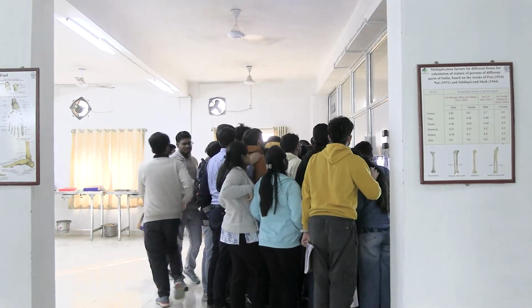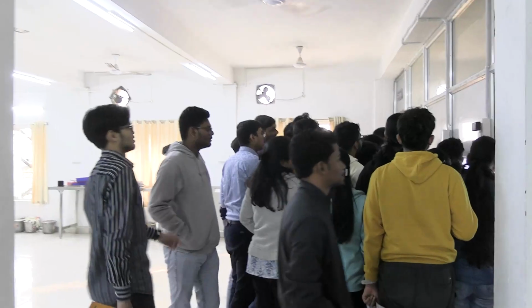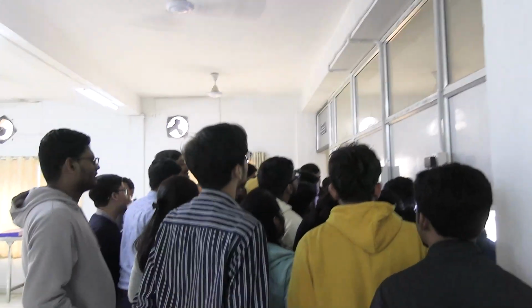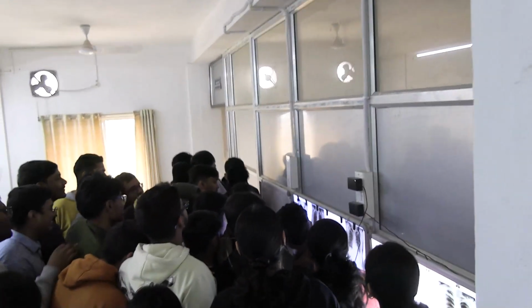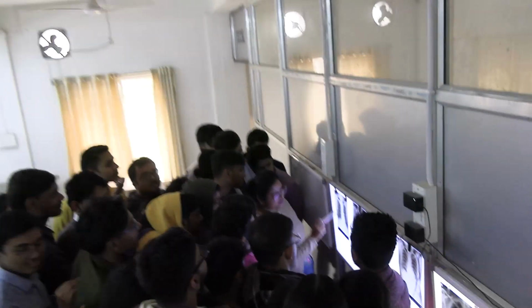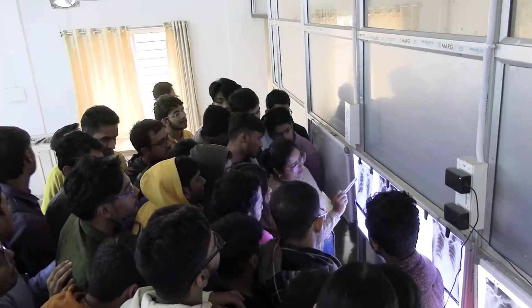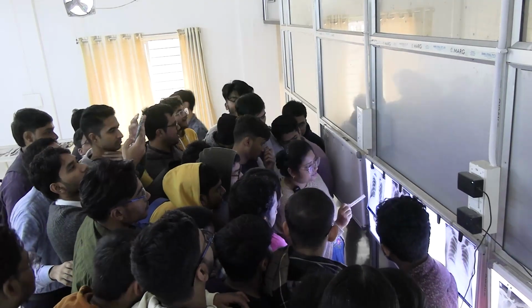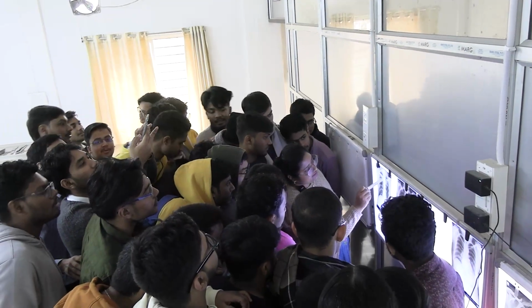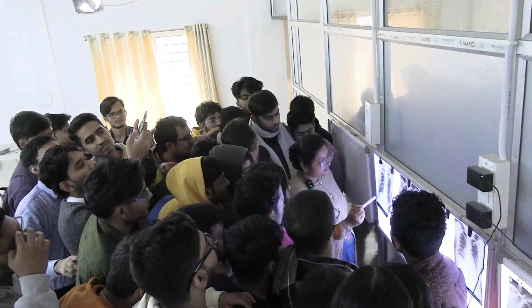This is the tracheal shadow, and these are the vertebral spines. Here is the clavicle, with sternal end and acromial end. This is the scapula. These are the posterior rib shadows and these are the anterior rib shadows. You have to identify them. These are the bronchovascular markings in the lung shadow. Here is the first rib, and above this is the apex of the lung.